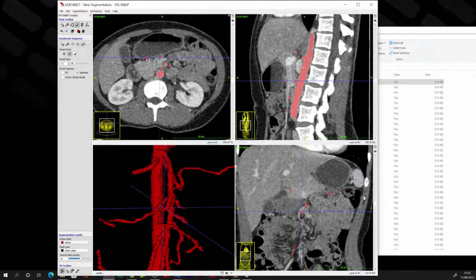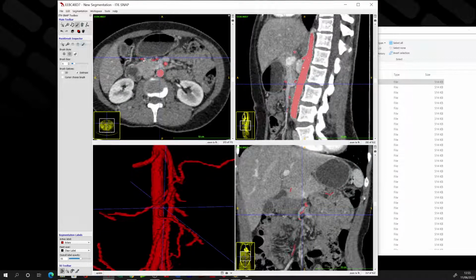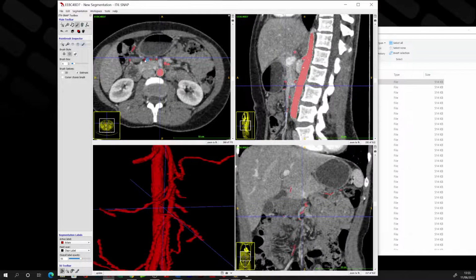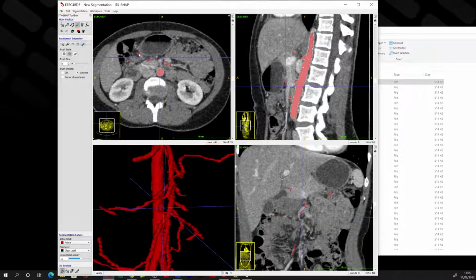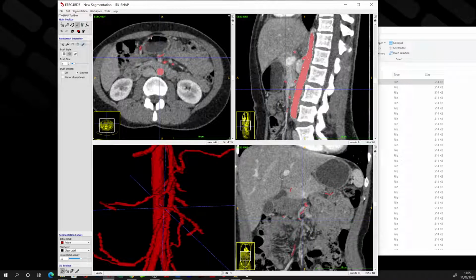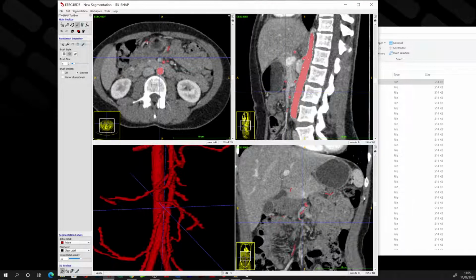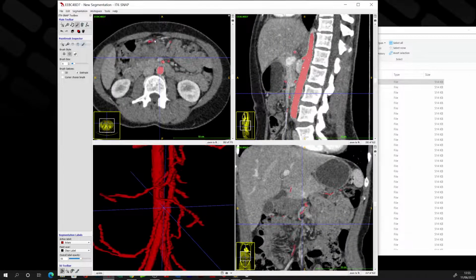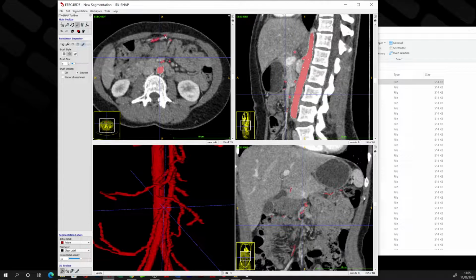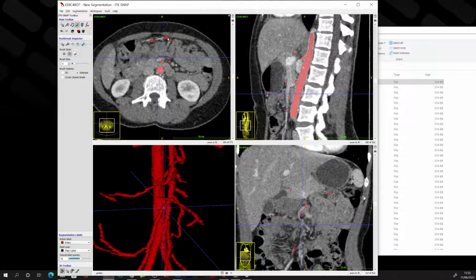And I think in this situation, adding this in will be useful, as it will help you identify the subsequent GV, and also it eliminates another potential vessel which you can readily identify, but if you left it peripherally unsegmented may confuse you, and you may misidentify or mislabel it as something down the line, certainly when you're more inexperienced and just learning about building your case experience.